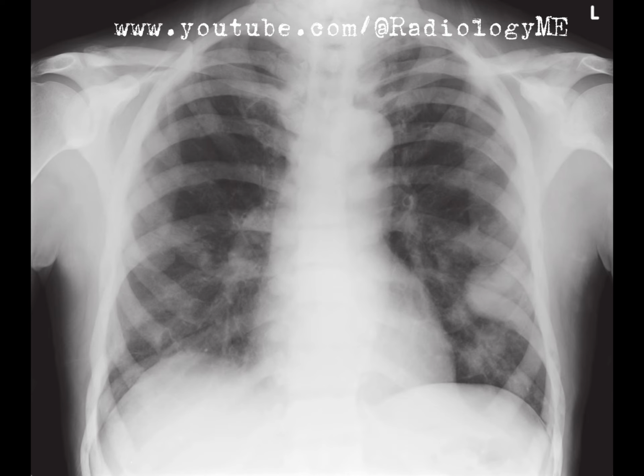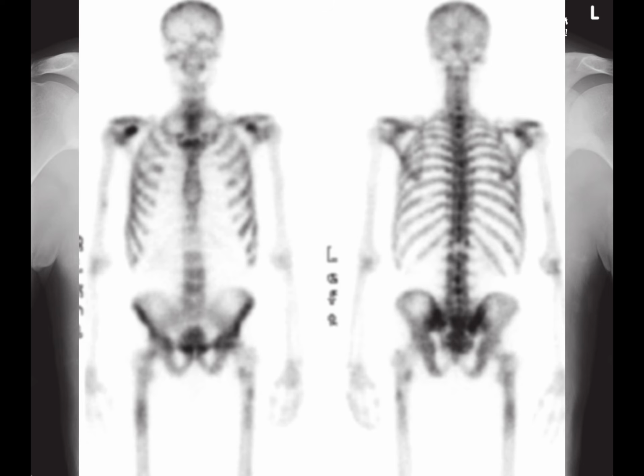The next steps would include reviewing any previous imaging, particularly bone scans, which could show a superscan appearance, meaning diffusely increased radionuclide uptake throughout the skeleton with reduced renal and soft tissue uptake. This is a nonspecific finding often seen with widespread osteoblastic metastases.